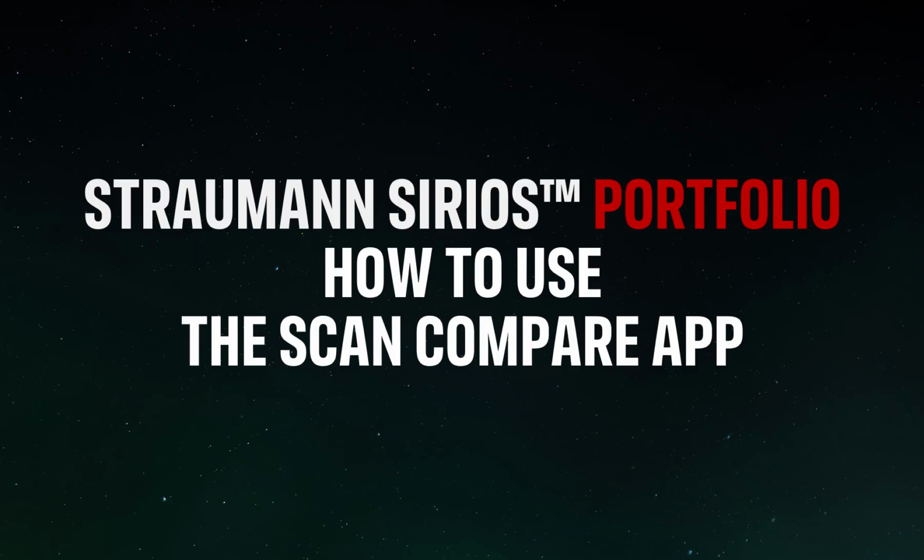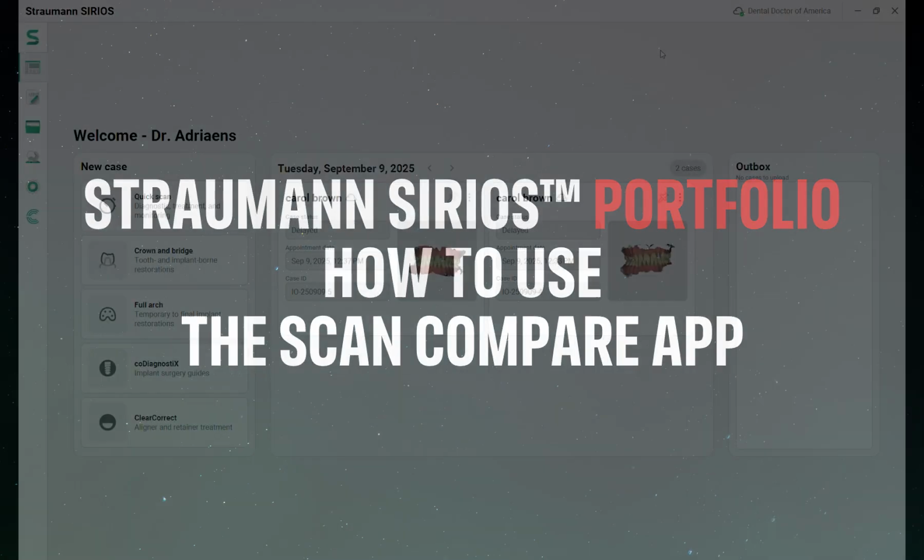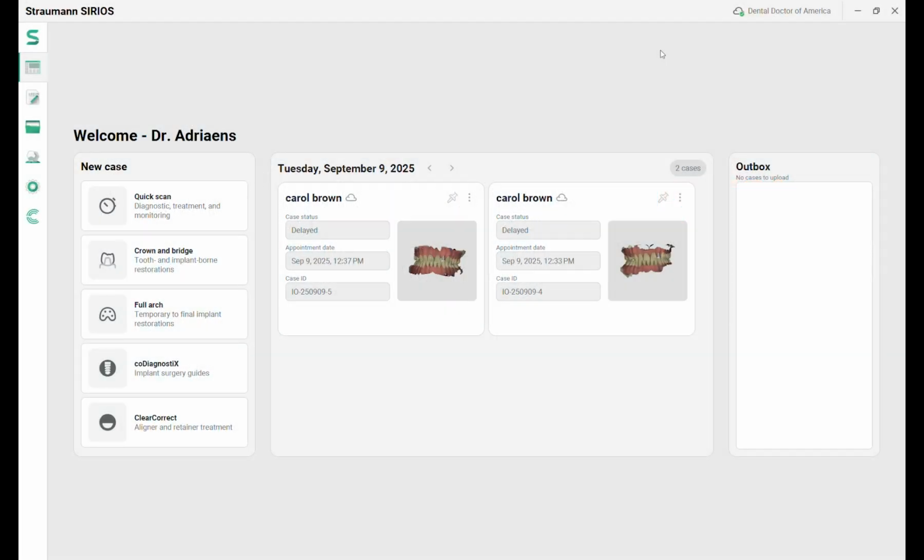Straumann SIRIOS portfolio. How to use the Scan Compare app. Easily access powerful applications like the Scan Compare app directly from the Straumann Axis platform.